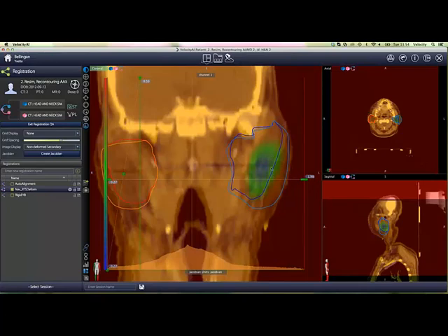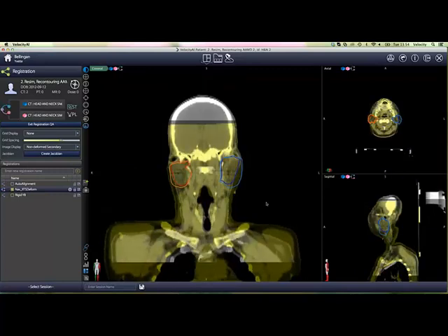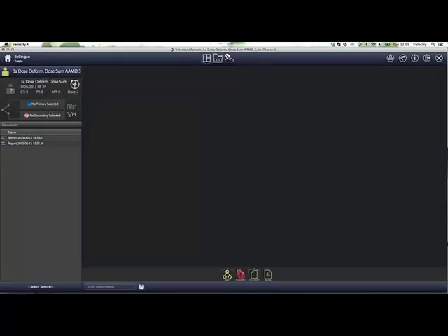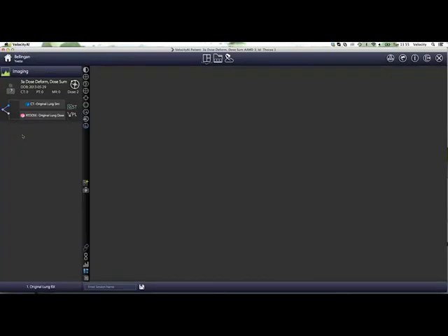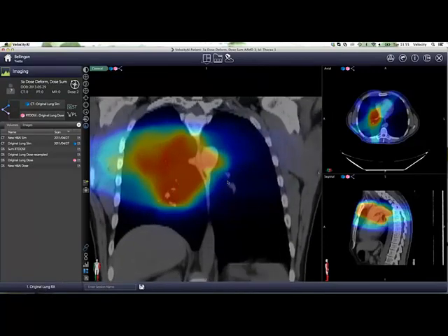And we can use this QA to have a look at the direction vectors as well. So you can see in the dose summation how these voxels moved when they did the dose summation. Because remember, we speak of the primary as the center of the universe, and when we do the dose summation or a deformable registration, we're rewriting this into the coordinate space of the primary. So if we look at our displacement vectors, we can then assess how much movement has taken place. All right, so we can see the amount of warping. And likewise, we can look at the summed doses as well with the QA.